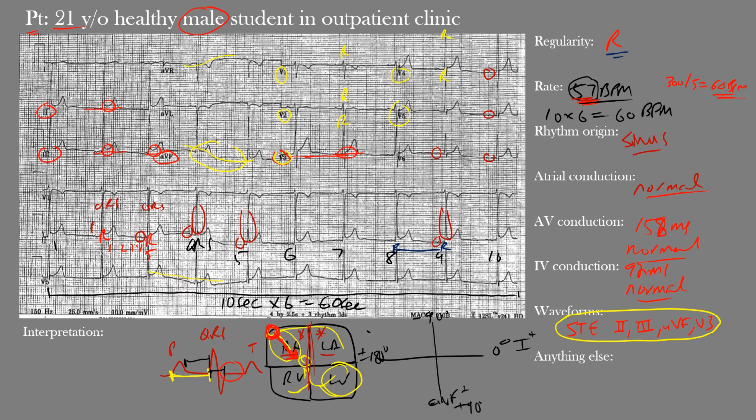So what we're doing here is looking at the QRS or ventricular axis. Because it's the QRS axis, we're looking at the QRSs. So we're going to look at lead 1. It's hard to make out the QRSs here because they're pretty much sitting there, but they are positive. Because they're positive, we head in this direction, towards that positive end of lead 1. And if we look at lead aVF, you can see this is certainly positive, so positive heading towards that bottom lead. So the axis sits in here.